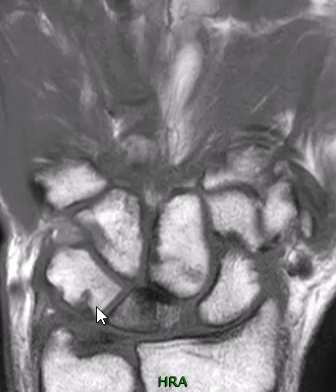And they also had a few little bone erosions scattered around and just diffuse joint space narrowing. So I believe they have rheumatoid arthritis that's causing these findings in the proximal wrist. And then there's abnormal stress between the capitate bone and lunate bone, and that may be the etiology for the avascular necrosis there.